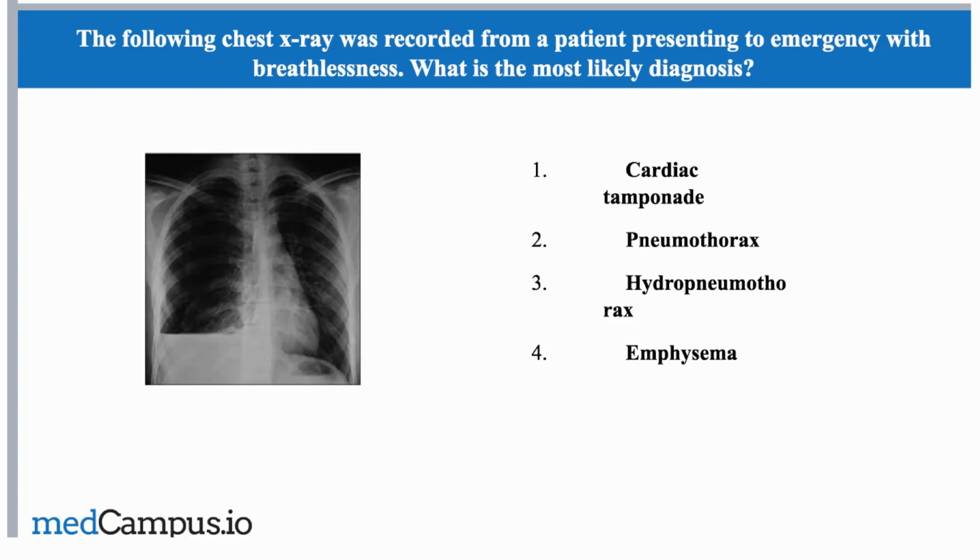Hello doctors, let me read the question for you. There is a chest x-ray which was recorded from a patient presenting to emergency with the complaints of breathlessness. What is the most likely diagnosis? So the examiner is trying to test the basics of reading a chest x-ray.